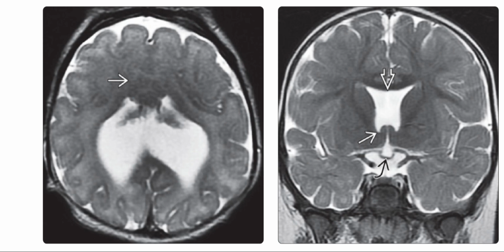On the right image, we can see the analysis of coronal images, and it shows a squared-off appearance to the lateral ventricles with inferiorly pointed frontal horns. There is absent septum pellucidum and hypoplastic optic chiasm, which is characteristic of septo-optic dysplasia.